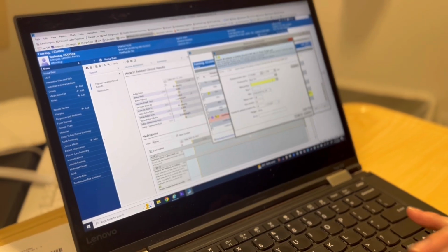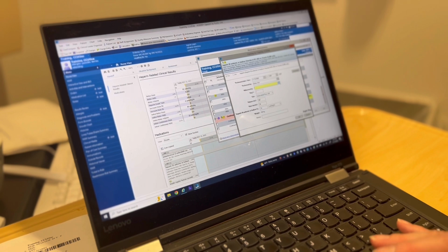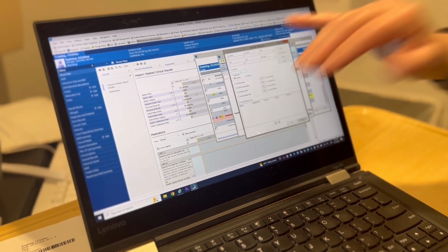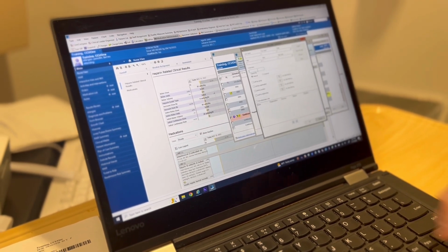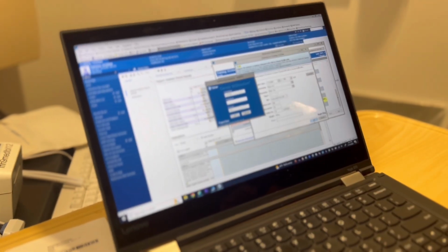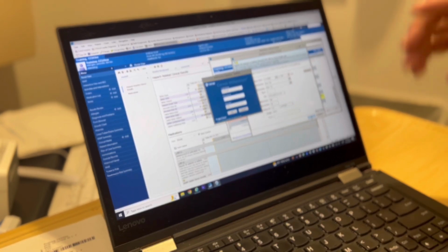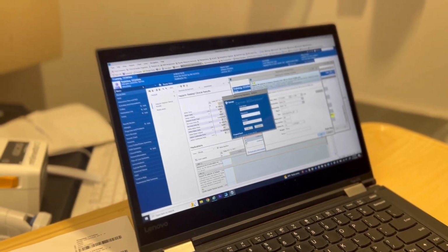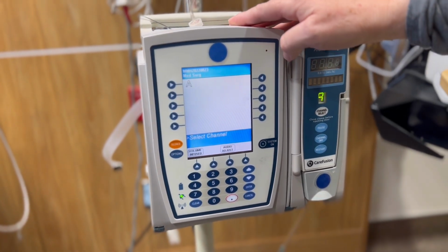My witness is going to be, I'm going to find my friend. Click this. Because we're in train, I have to go to username. You would normally look under last name. Okay, when I do that, notice they have to come in and sign. So at this point, I need to be ready for them to be able to look at my answers and my pump. So I'm going to program my pump. I'm going to say, no, it's not my new patient. I am going to be on med surge.